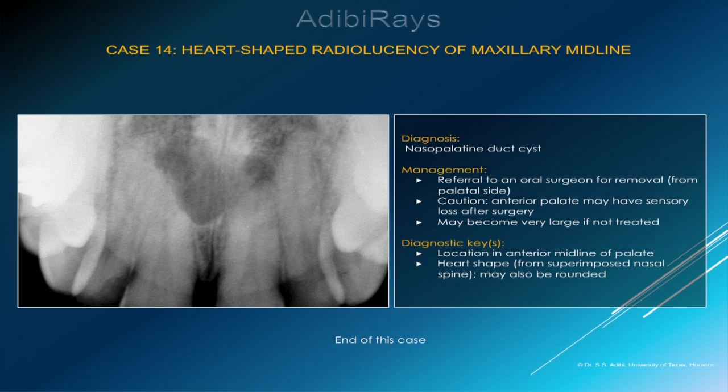Key diagnostic features in this case are the location of the lesion in the middle of the anterior section of the palate, and the heart-shaped or rounded appearance of the lesion that superimposes the nasal spine.